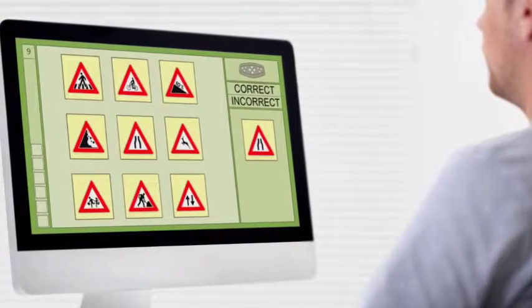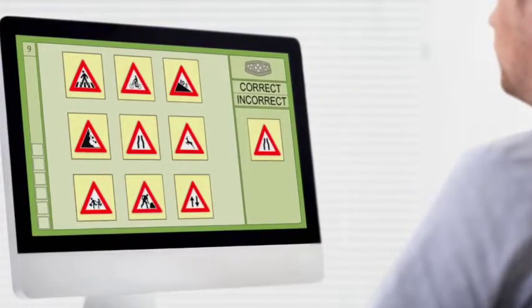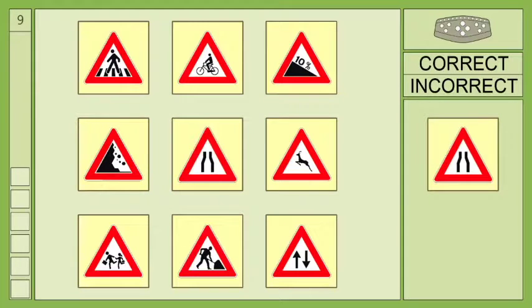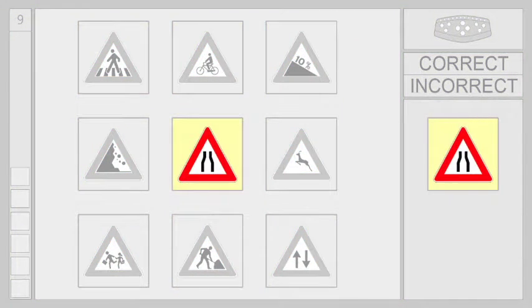The RIHACOM training module, Attention and Concentration, trains selective attention. When focusing on a target-oriented action, this function is needed for differentiating important from unimportant things. Therefore, relevant stimuli can be processed, whilst all others will be suppressed.